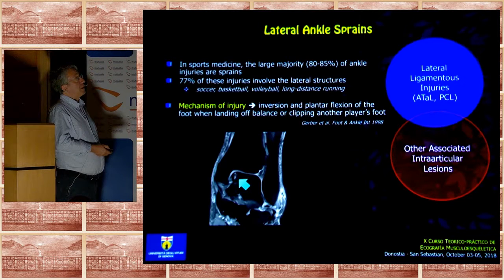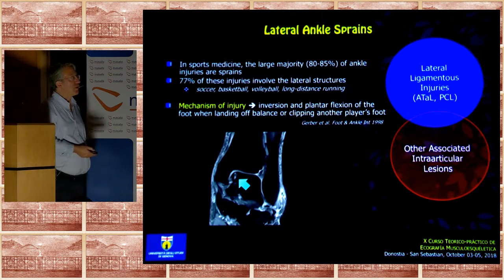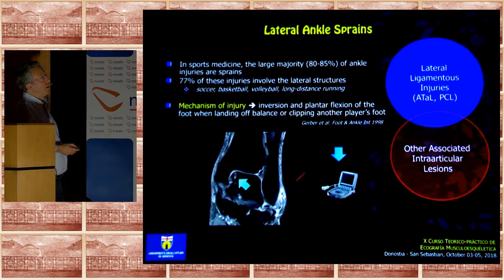Remember that timing of ultrasound is also important. In general, in the very acute setting, ultrasound tends to overestimate the severity of the injury. Anyway, the technique has a really great role to check the status of all of these ligaments.